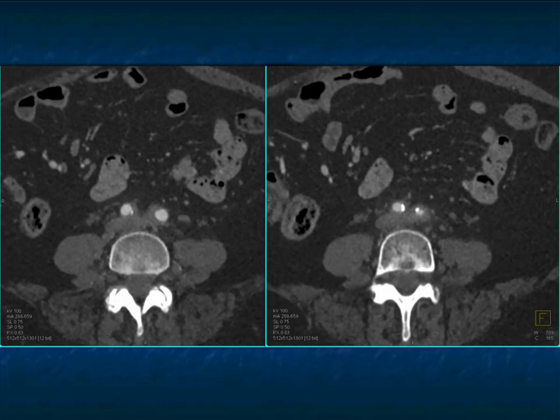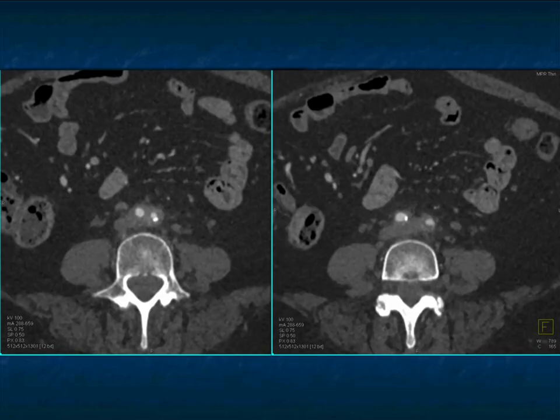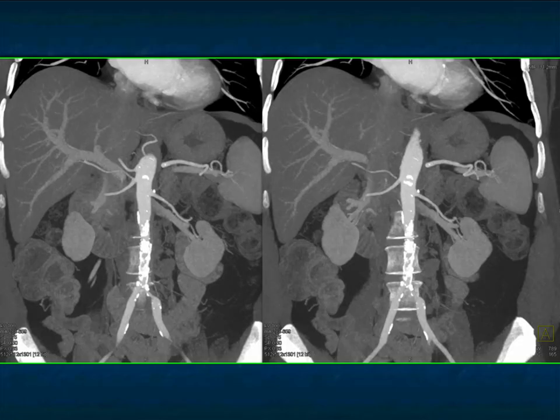One of the things with IgG4 disease, it extends down the aorta, down the common iliac arteries, and can be fairly extensive. The lumen of the aorta is decreased. The soft tissue infiltration, very nicely shown here. You can see the lumen of the aorta is decreased because of the involvement. There is calcification, which is a result of atherosclerotic disease, but with the vasculitis, the IgG4 disease, IgG4 levels will often be high. Very nicely shown the narrowing, and this can persist.